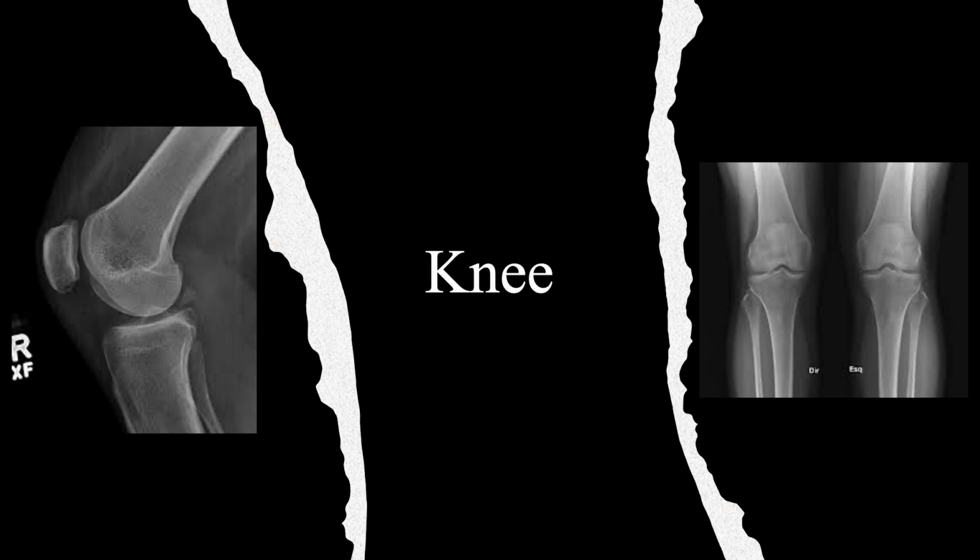And then again, check everything for any signs of fractures. So I like to start myself, top to bottom, look at the femur, look at the tibia, look at the fibula, and I look at the kneecap last, or the patella last. That's just what I like to do. You can choose your own style of doing things, though.